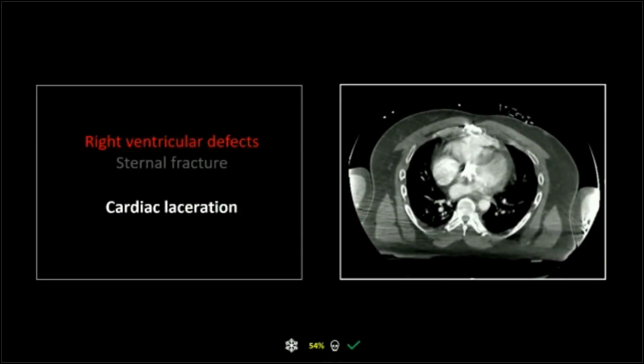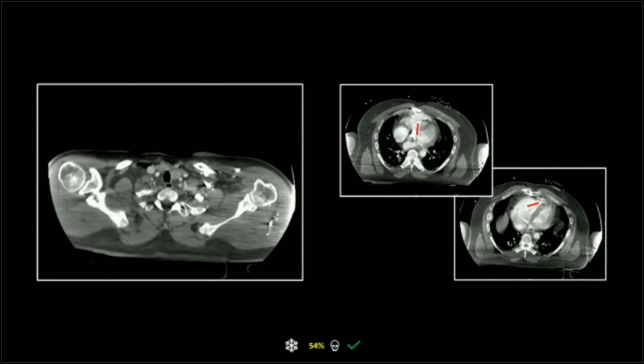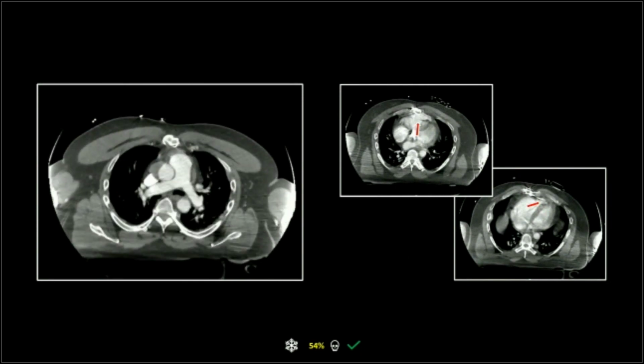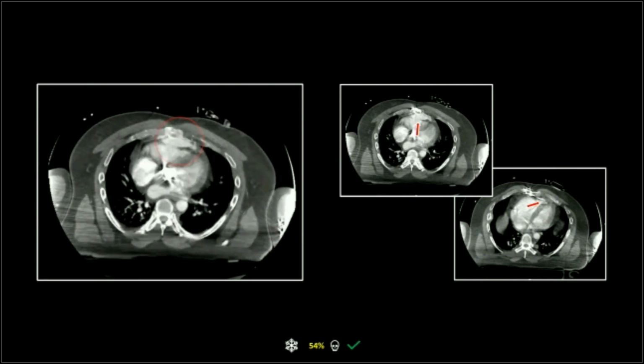All right, lastly, this is one from Kenny Hertz. It's fairly recent. This is a cardiac laceration where this patient has just blown out his right ventricle on the anterior side of the right ventricle, right up kind of towards the outflow. And in fact, lower down, there's another one right at the right ventricular apex. So this patient took a very hard blow right on the front of the chest. This was a snowmobiling injury. This guy hit a tree while snowmobiling with his buddies.